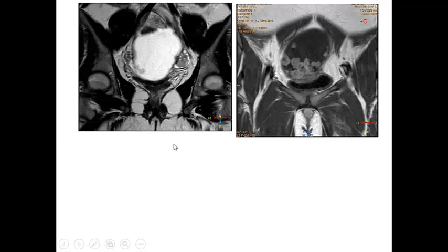This is a case. She was a female patient, 15 years old, coming with this adnexal mass, likely ovarian in nature, with multiple papillary projections inside, enhancing. But what is the pattern of this enhancement? And this is the other ovary, so it is on the right side. So we have a right ovarian mass with solid papillary projections, enhancing on the post-contrast study. So we have solid component and cystic component. Is it malignant, borderline, or benign? We have to go to the functional imaging.